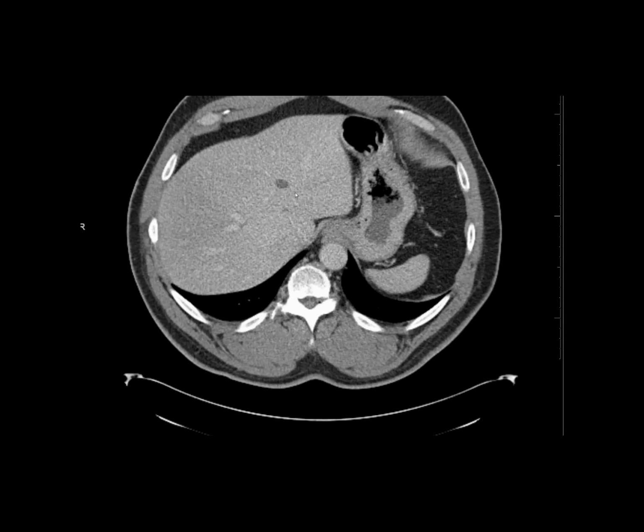This one might be too small to characterize, but given 25 is a little bit higher than expected on an ROI, and assuming there's no volume averaging here because I'm in the center of the lesion, I would be highly suspicious for this, and I would want to double check the prior to see if it was there or not.